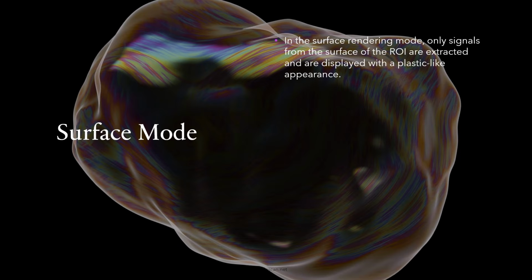Now, let's focus on surface rendering, which is a powerful technique for visualizing external anatomical features and surface anomalies in 3D and 4D imaging. In surface rendering mode, only the signals from the surface of the region of interest are processed and displayed. This results in a plastic-like appearance of the anatomical structures, making it easier to visualize the external contours and features of the body. The emphasis on surface anatomy is particularly useful for detecting external defects or deformities.